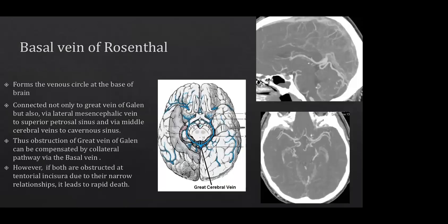So moving on now from the internal cerebral vein, the vein of Galen, the straight sinus, to another deep venous system, the basal vein. Again, a very, very crucial vein for the normal hemodynamics, and it's very important to understand the crucial role it plays in draining quite vital parts. And not only that, how it is hemodynamically related to the other venous structures. So as I said, the internal cerebral veins are in the roof of the third ventricle, but the basal veins are somewhere around the base.